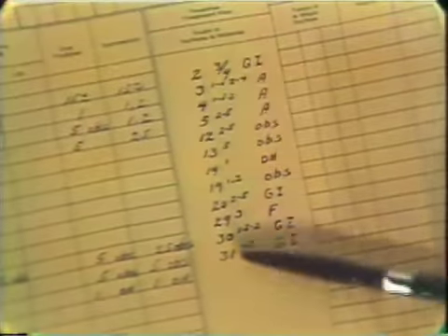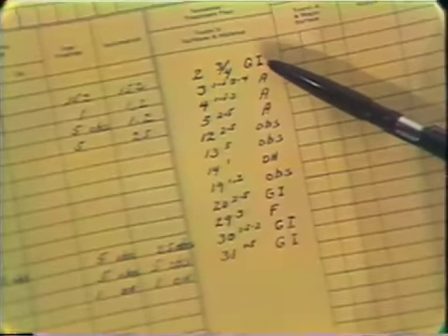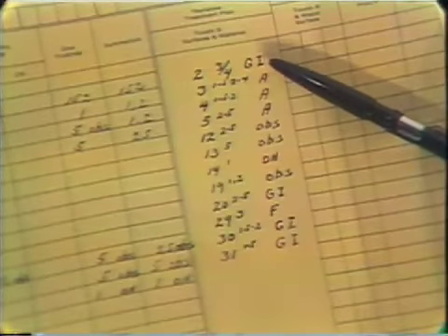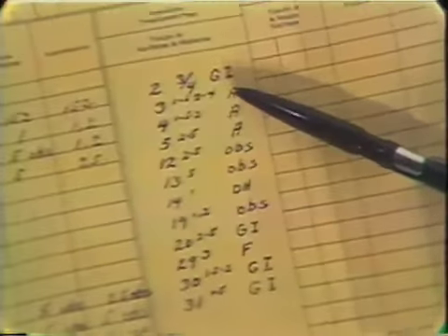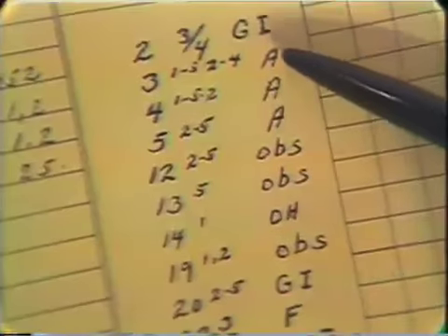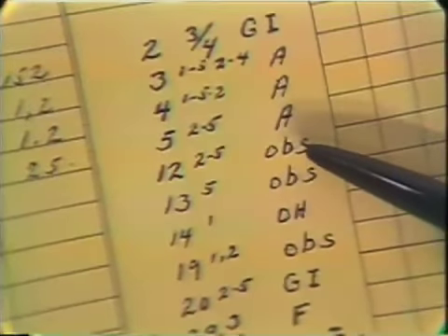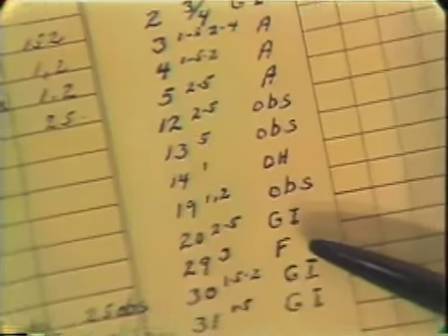Now if we look at the tentative treatment plan, which is listed in numerical order from 1 through 32, we make decisions on what type of restoration will be placed. For number 2, a 3/4 crown, gold, indirect, is indicated. And we do continue and make decisions as to what surfaces are involved and what material will be used to do the restoration throughout the treatment plan. Number 12 is observe. Number 29-3 will be done with gold foil.